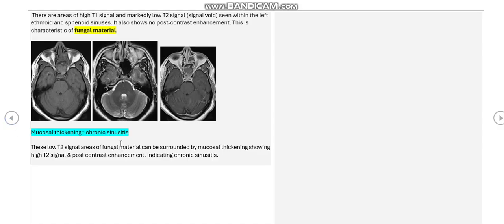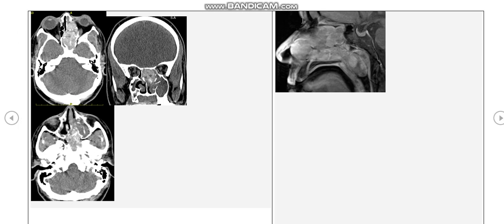Okay, so how to distinguish between them? Before this, how will sinonasal polyposis appear on the MRI? It is only mucosal hypertrophy, so it will appear as the same signal of the mucosa on T2. The mucosa on T2 weighted images is of high signal, hyperintense. So the mucosal polyps will be of high signal on T2 weighted image.